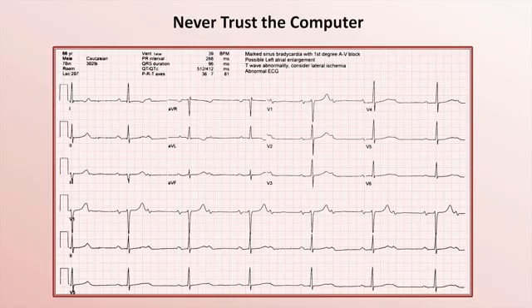Luckily, however, when the patient showed up on the day of surgery, still feeling fine, an anesthesia attending double-checked the EKG before proceeding with the case, and she noticed a funny extra waveform attached to the back of the T wave right here. And she further noticed that the funny extra waveform didn't just happen once, but again and again in a very consistent pattern.